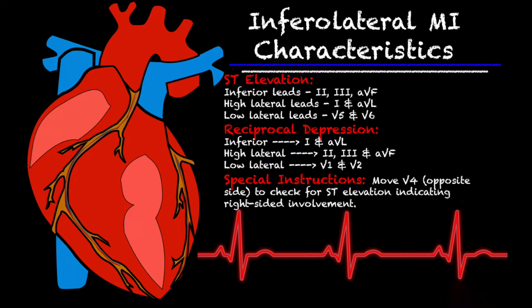So just to recap, you may have an inferolateral that includes all the inferior leads and only the high lateral leads, or the inferior leads and only the low lateral leads, or it could be the inferior leads and all of the lateral leads. I hope that makes sense.